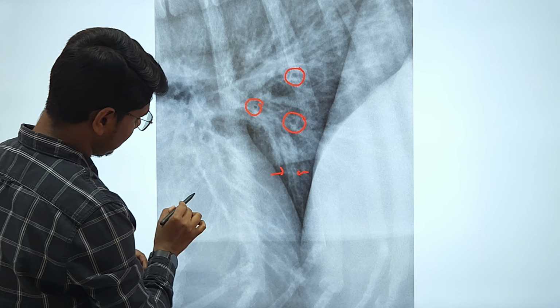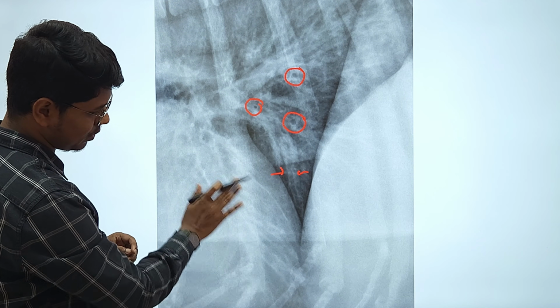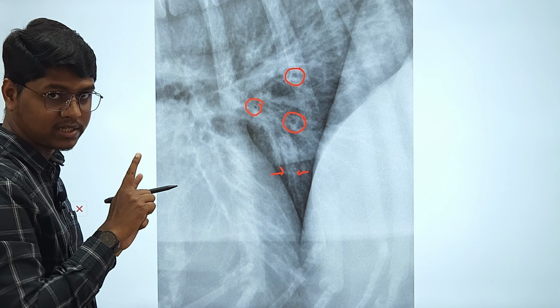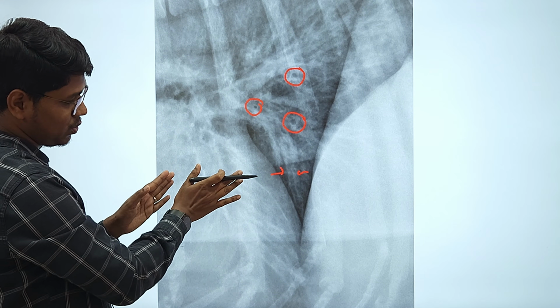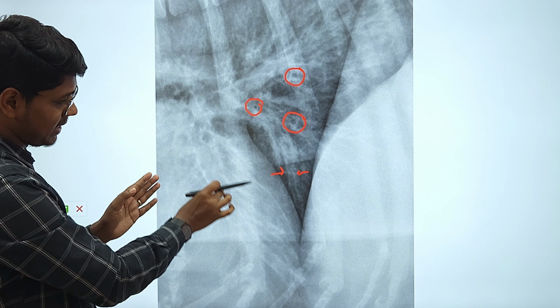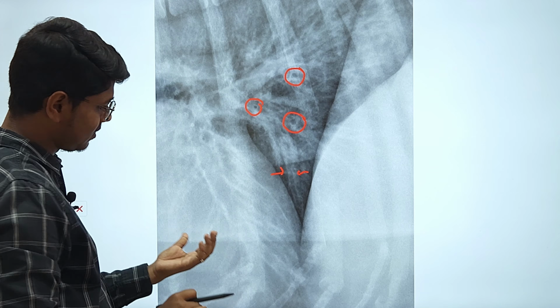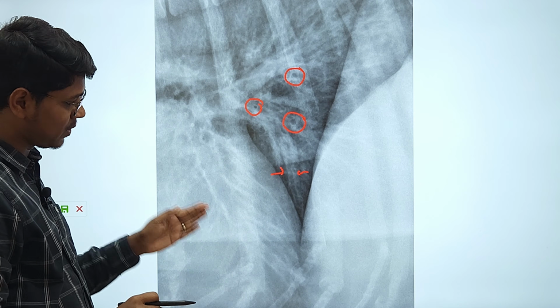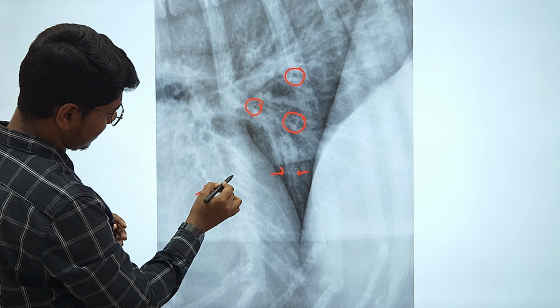Very nicely seen. This particular bronchial wall is thickened, the bronchial tree is visible, but it is not the alveolar pattern. In alveolar pattern, you will find a soft tissue opacity and you will find an air filled bronchus. But here the heart is actually providing contrast, and you can see the tram lines. Okay, you can see these tram lines.